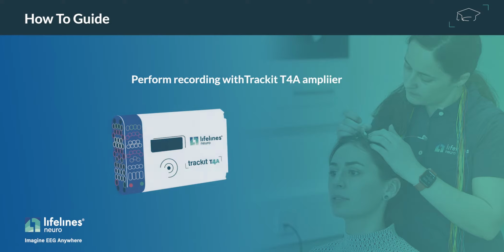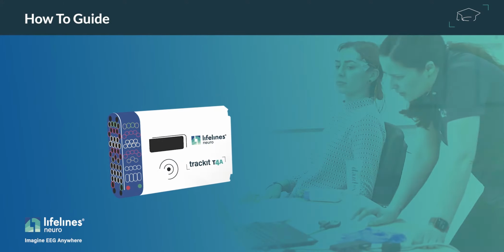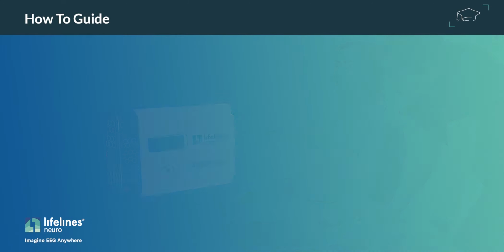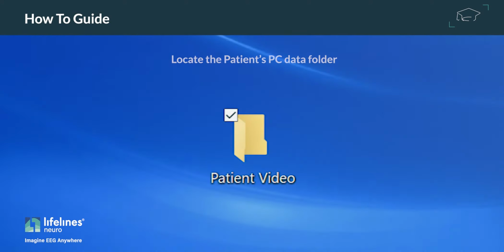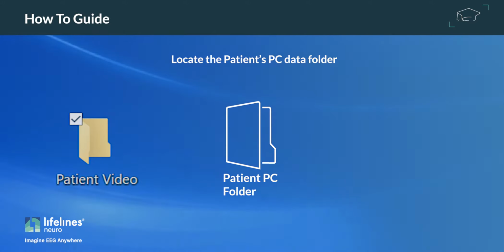First, perform your recording as usual with a Trackit T4A amplifier. When you are finished acquiring the study, stop the recording. Locate the patient's PC data folder. It should be on the desktop in the Patient Video File folder.